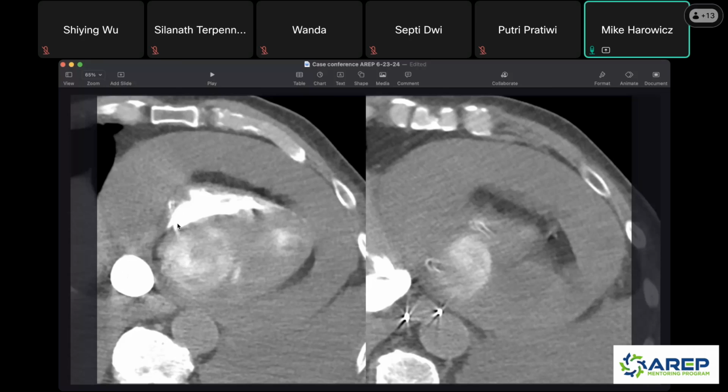And what I'll point out is that the most obvious thing here is that there's a ton of fluid in the pericardium. This is a large pericardial effusion. So when you see a big pericardial effusion, you need to think to yourself, what's wrong? Because something is very wrong. Does this person have a history of malignancy and maybe they have pericardial mets? Did they have some sort of trauma, maybe some rib fractures that were near the pericardium? Or is there something else maybe pouring blood into that region? Infections can also do it too.